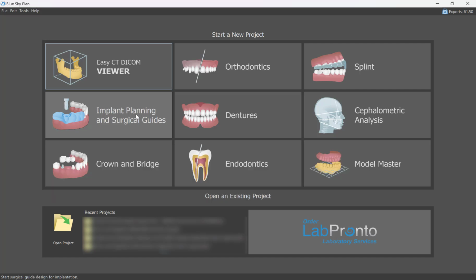But as you start progressing with your skill in designing cases, you're probably going to want to tackle more complex cases. And so we'll try to maybe do something to make this a little bit more difficult and do some features that you probably couldn't do in the wizard mode.